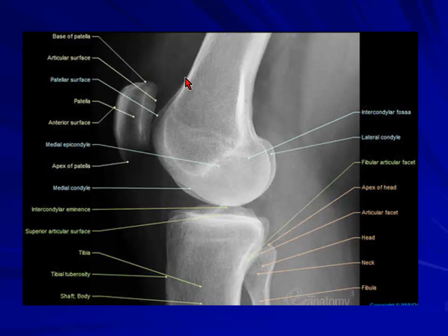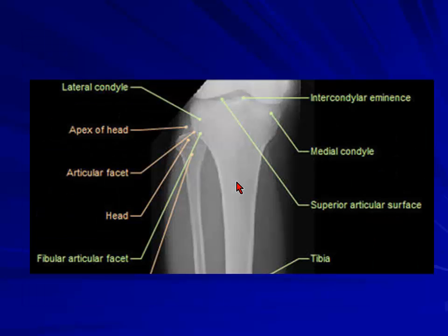The other thing is you need to look at the suprapatellar fat space. So if there is any injury, any inflammation, you lose this and you get a fluid-filled space, and that is suprapatellar pouch effusion. So looking at again the lateral projection, the articular cartilage of the condyles. I don't want to go into detail, we have already talked about that. So AP, again looking at this. So you've got the fibular head, and then you've got the neck and the articulation between the tibiofibular joint.